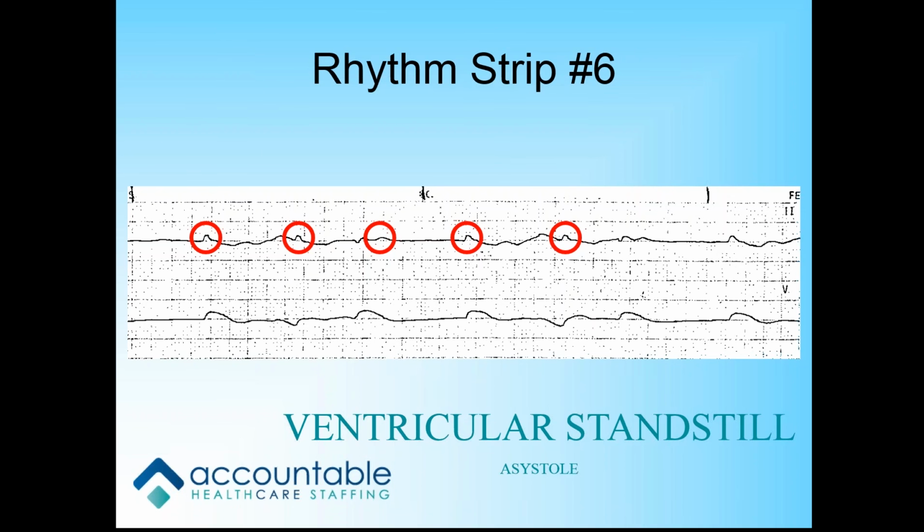Okay. Can you see that now? I can now. I never would have gotten that right. Well, the thing you have to watch for is that if you look at those P waves, all except for the third one, they all look very much the same. That's kind of a clue that this is ventricular standstill. It's not truly fibrillating. When we get to V-fib, you're going to see it looking like true fibrillation.